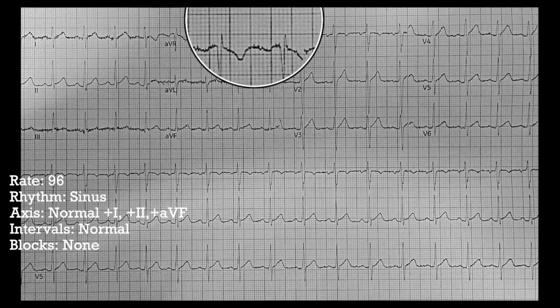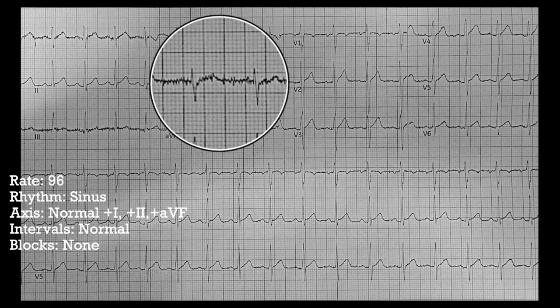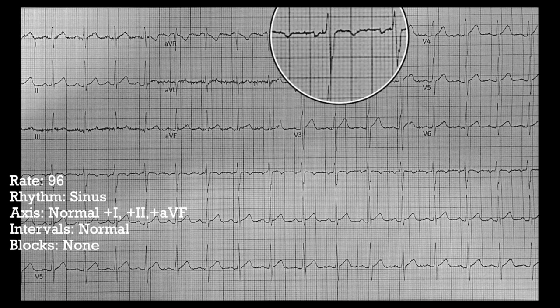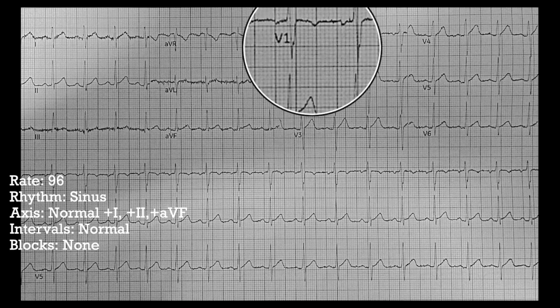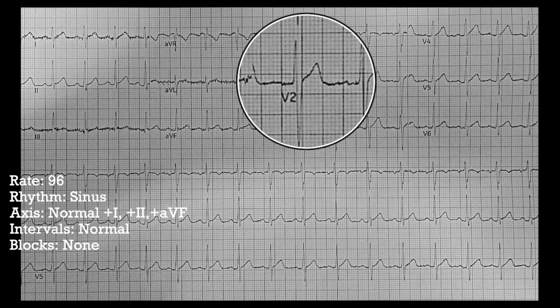No elevation. I ignore lead aVR generally. There is stuff you can read in it, but let's just ignore it. No ST elevation, no ST elevation. Going through the precordials, there's lead V1, no ST elevation. No significant ST elevation in V2.